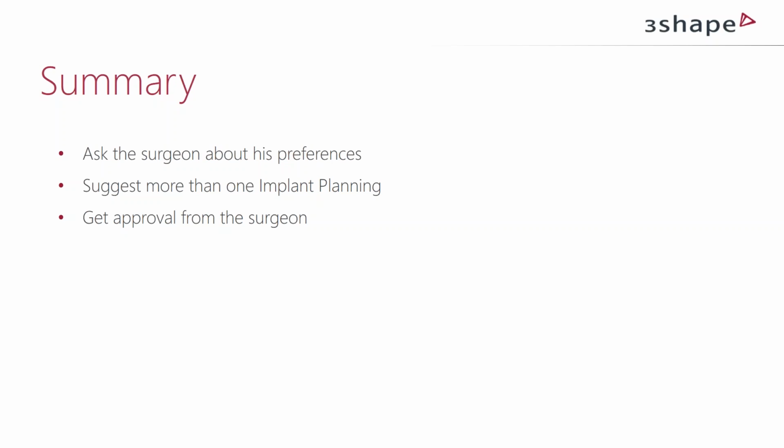Then there's a question on the sleeves available in Implant Studio, whether we will have OEM sleeves and third-party sleeves, or one over the other. The way it works today is that all the implant companies decide which components they want in our software. Many of the companies who have their own fully guided solutions also have their sleeves, and we have them available. There are exceptions to that, and for most of those we do have third-party sleeves available from different third-party manufacturers.